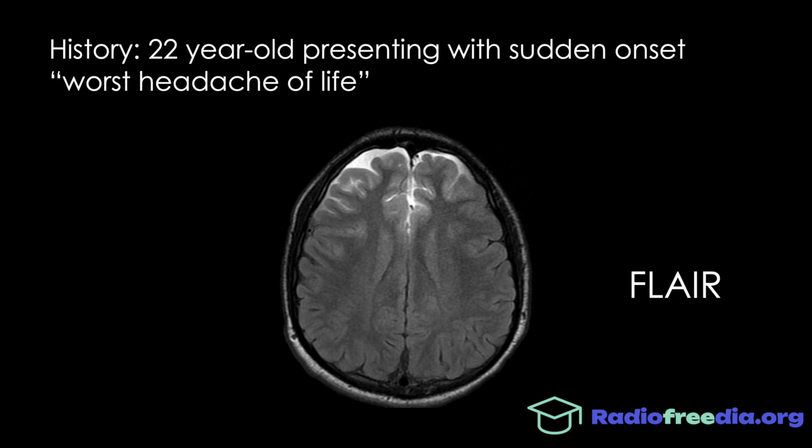Can you spot the finding in the image yet? So we actually have a mixed pattern here. Near the frontal lobes, we have bright CSF signal, but along the rest of the brain, we have dark CSF signal. So the fact that the CSF is dark in the majority of the picture means that this is a FLAIR image, and the bright CSF signal near the frontal lobes is abnormal. We know something extra is there causing this incomplete suppression of the CSF fluid.